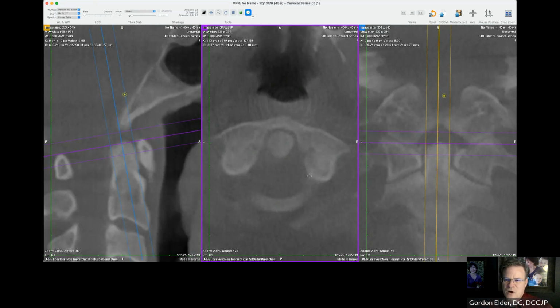But what we found with a cone beam is if I was going to expand this slice large enough to see the foramen magnum, we would lose a lot of definition. And so things just start to get more difficult. And we found that he allowed this in certain cases, and we found that most of the time it works just great. So that's what we're going to use. We're going to use anterior point 1, which is here, the notch between the anterior arch and the lateral mass on each side, and the posterior point 1, which is there.